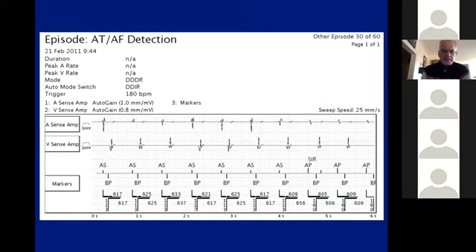Here's another example of some oversensing. So it starts as atrial sensing and V pacing, and then again, because of the sensor indicated rate, probably the patient is exercising, A pacing starts. A pacing, and then this little signal again. What is that? Nobody wants to? Ventricular oversensing. Yeah, so it's a far field. It's a far field signal again.